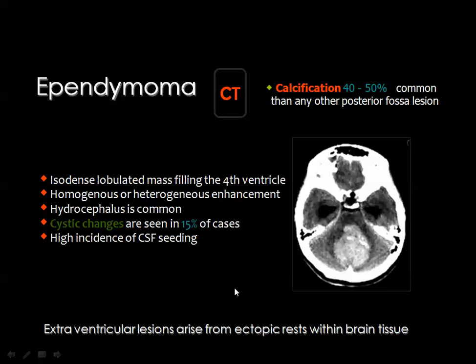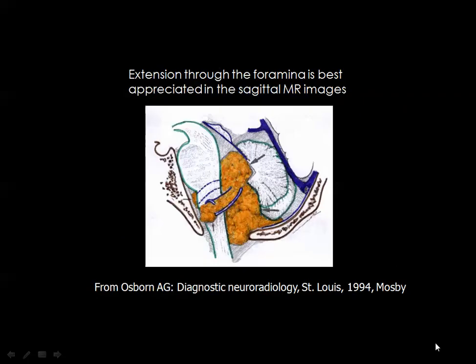of the cases. And one of the classic criteria of ependymoma is its ability to creep within the fourth ventricle and extend through the outlet foramina of the fourth ventricle by somewhat plastic extensions, which are not seen in the rest of the tumors occurring in this area.